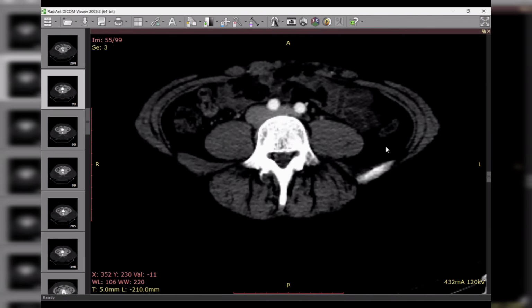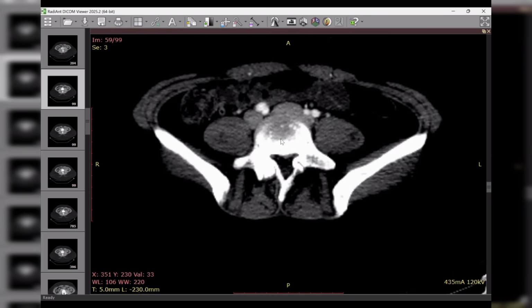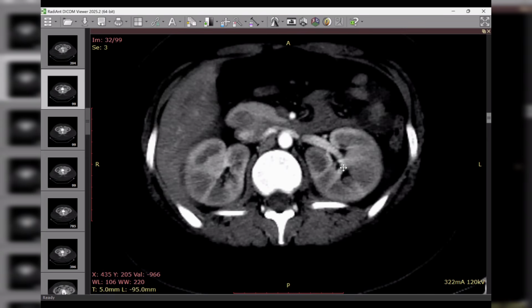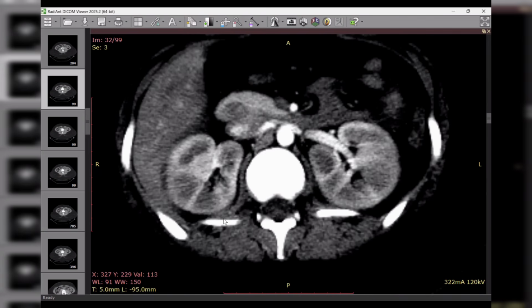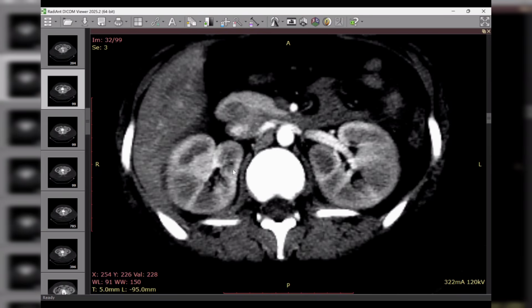This is 1 minute. I could go up. Yes, just focus on the renal system. Okay, so I want to see this image. No, we cannot see the kidney. So what do you think about this kidney? Yeah, this is the kidney. So in this kidney there are small hypodense areas seen in the left kidney, with similar hypodense areas also noted in the spleen. So overall findings are suggestive of an infective disease process, which is involving the left kidney as well as the spleen.